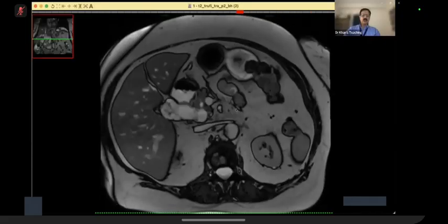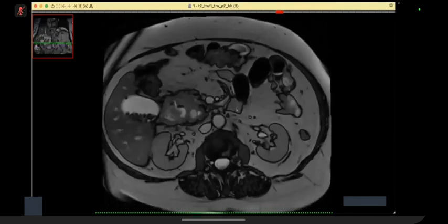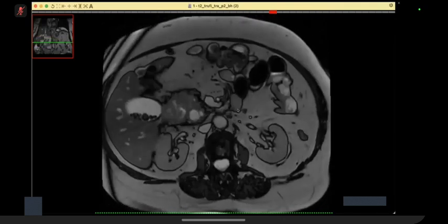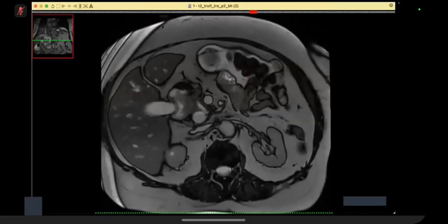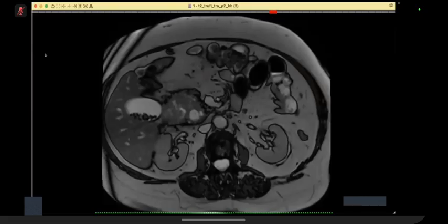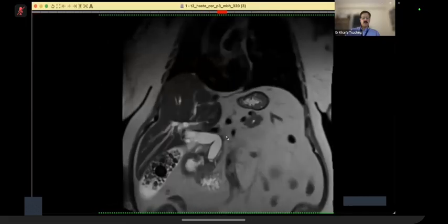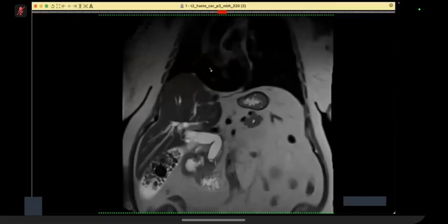So what is your conclusion till now? Still now my conclusion is that this could possibly be a malignancy, a cholangiocarcinoma, or a periampullary CA, which is leading to all these changes, because I don't see a calculus at the distal end of the CBD. But I would like to see the rest of the images also if they're available to me.